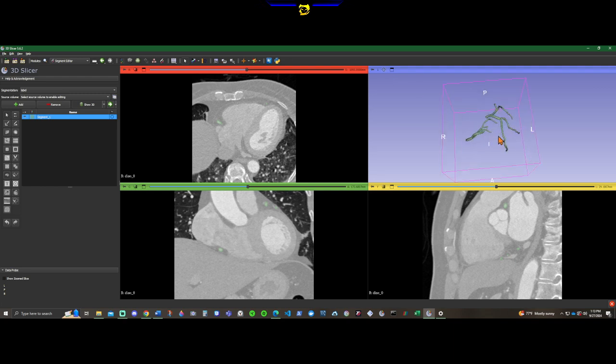So you'll notice that sometimes it'll show really far away, like way down here or something, and all you have to do is click up here to center it and that'll change the view. Really quickly, you can control left click to rotate with this axis, regular left click just to rotate all around, middle mouse to drag, and then zoom in and out.